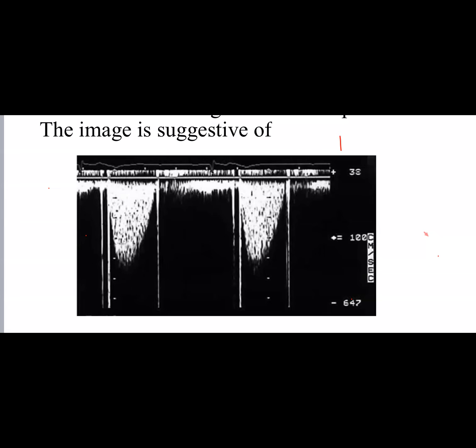So what else? I think there is a gradient over the valve. Very good. This is the aorta, by the way. So I have a gradient across the aortic valve, and this gradient is kind of 60. So the peak gradient is 60. That means I have a high gradient across a metallic aortic valve. Now look at this one here.